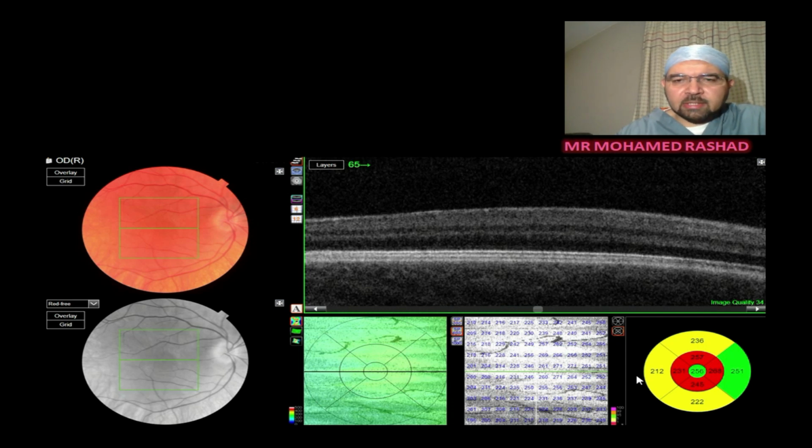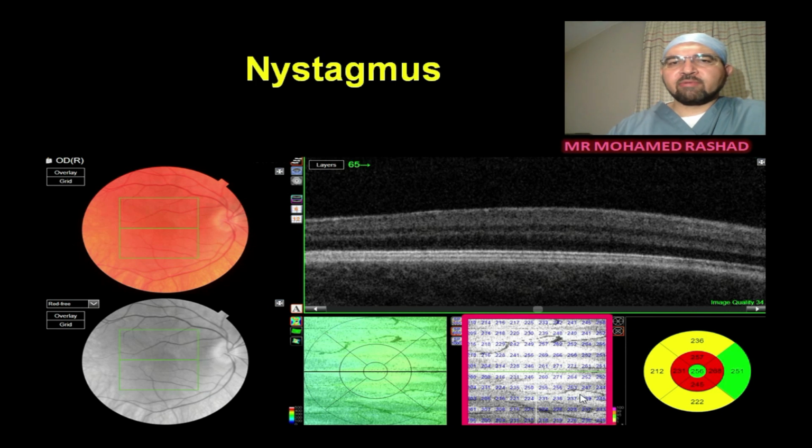This is another case here. I want you just to tell me what this shadogram is showing here. So you can find here that the lines are irregular here. So what is this? Okay, this is a foveal hypoplasia, but this thing here in the shadogram is an indication that the patient is having nystagmus. And the other thing is, what type of hypoplasia is this?